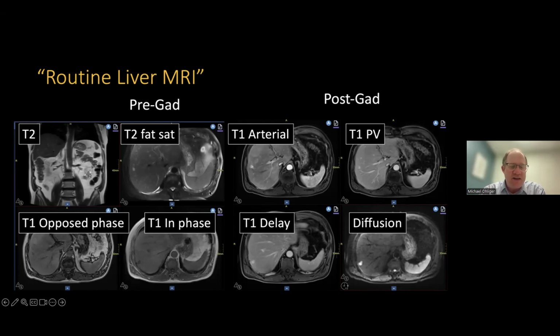So we'll have another acquisition, and you'll see this as you look at it, and it's almost always with fat saturation, and it's T2, and it's in the axial plane. Every institution, every MRI protocol for liver is going to have this. There are 2 purposes here. One is that you can distinguish fluid, ascites, from fat. Fat is bright and fluid is bright without fat saturation, but when you do fat saturation, you can see ascites fluid. Also, you can see tumors or lesions within the liver, and sometimes other organs, a lot better than you can when you do it without fat sat.